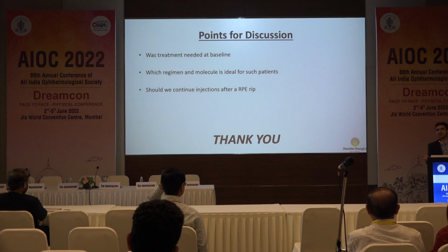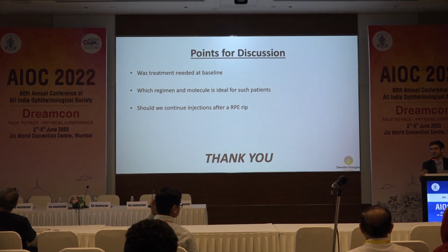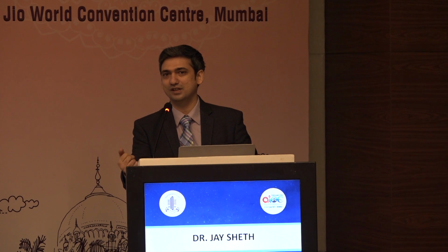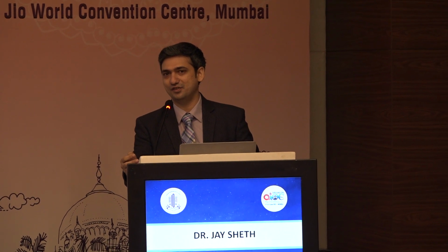I think most probably it could be a CSR with a PED. I couldn't see any network. Unfortunately, I have not done imaging after the PED had collapsed completely. Or there could be an underlying occult CNVM. That would be my second differential. Any comments?